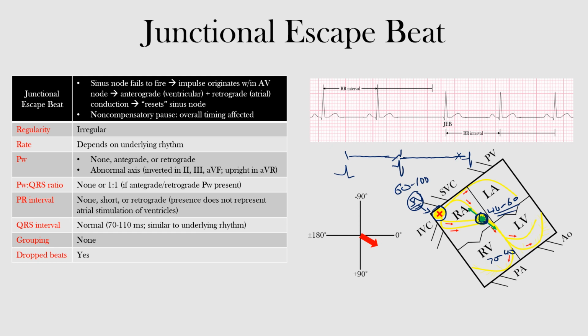So again, if you look here, this is our P wave, our QRS complex, and our T wave. Then the cycle occurs again: P wave, QRS complex, and T wave. Our normal R to R interval, from this R wave to this R wave, is occurring here. Then we would have another complex, but notice that our P wave is not occurring. It would come somewhere in this area, because this is where our next QRS complex would come. However, we don't have that occurring, so we're waiting for the beat, nothing's coming, and all of a sudden the AV node senses that and releases its own beat.